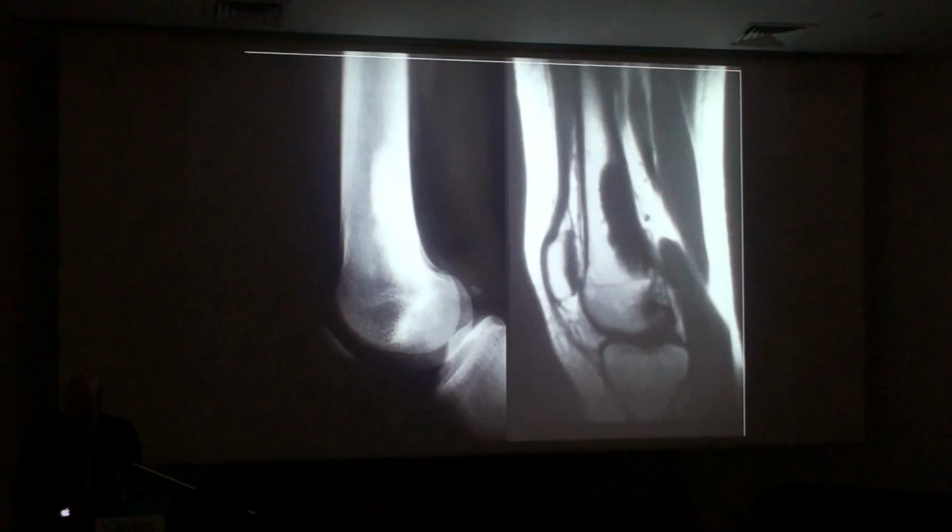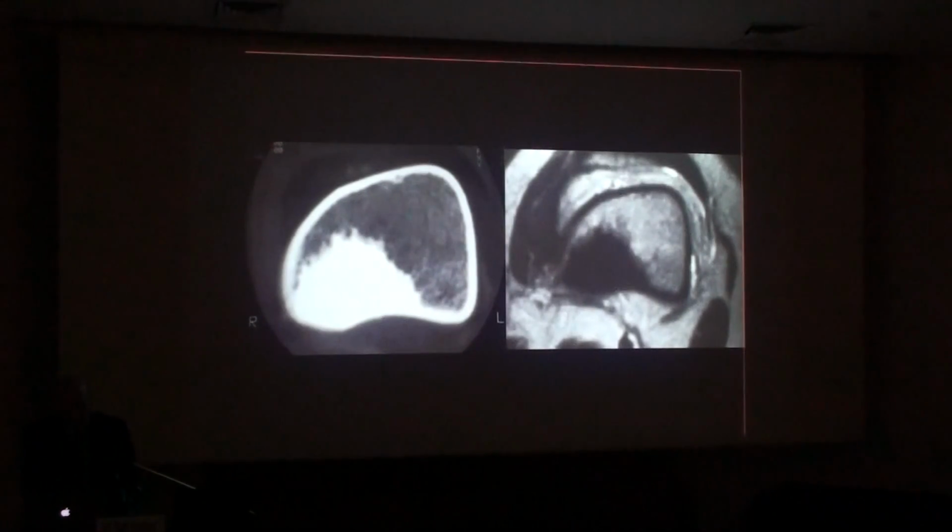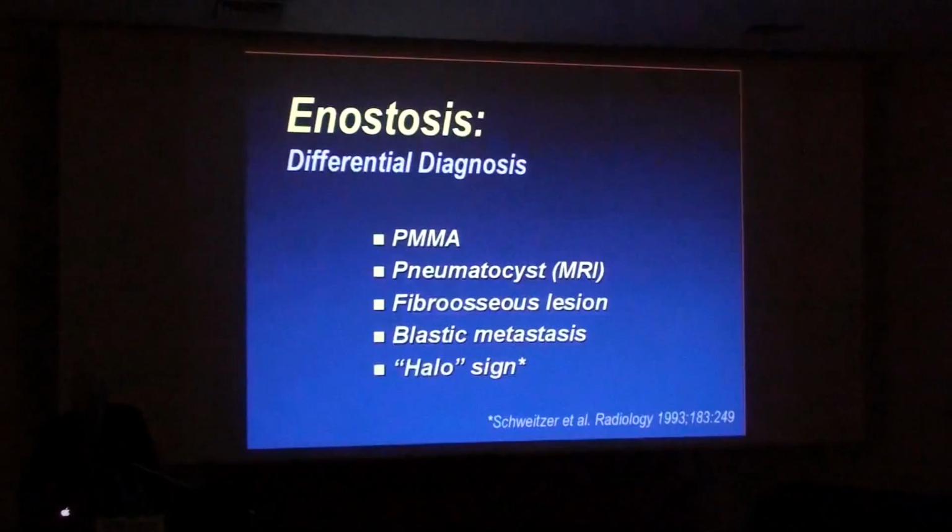And here, just probably the best example I've ever seen in a long bone: signal intensity or attenuation similar to the cortex, no signal on T1 weighted images, axial CT beautifully showing that spiculated margin, and no abnormal signal associated with it on fluid sensitive sequences on that T2 weighted image on your right. Just a perfect imaging appearance for a giant bone island.